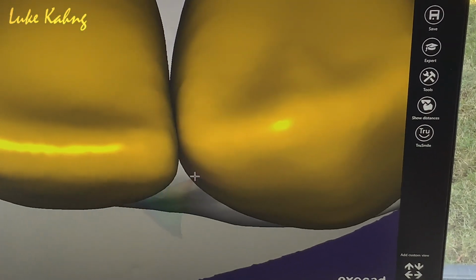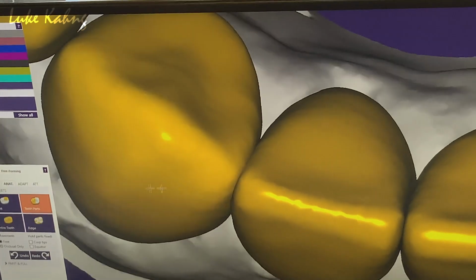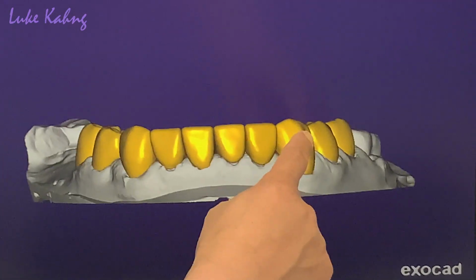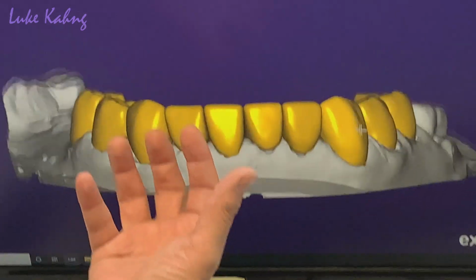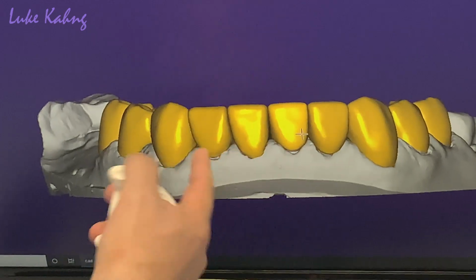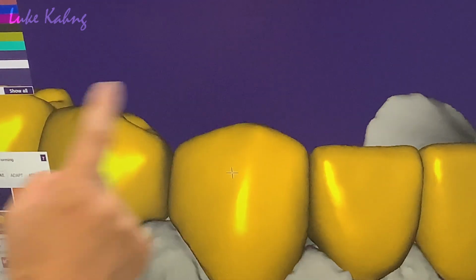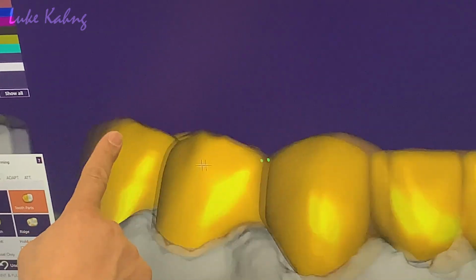A little bit more open is okay. Fine, great. Now, same as the other side. You see? Let's move it. All right. Better. Okay, now see the frontal view. Now this one, this third tuck in. Right, okay, that's good. So magnify, frontal view, exactly like this. Now this canine higher because that one's high. Canine marginal ridge higher and cusp as well. Marginal ridge higher, cusp higher.